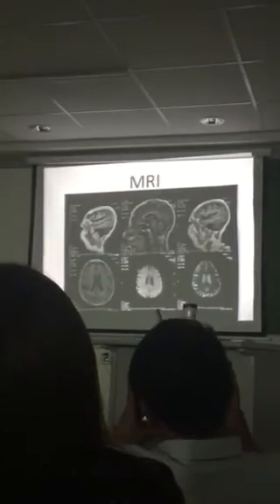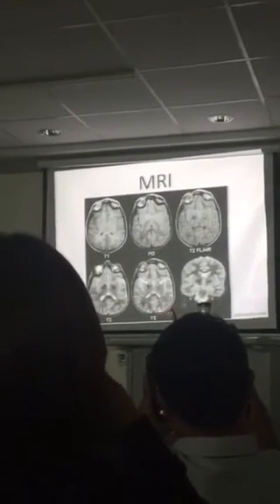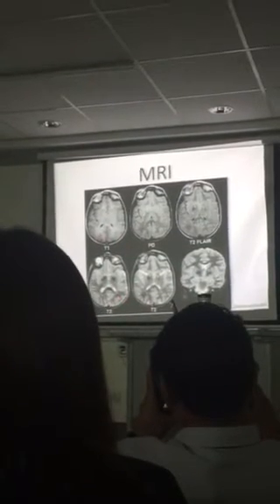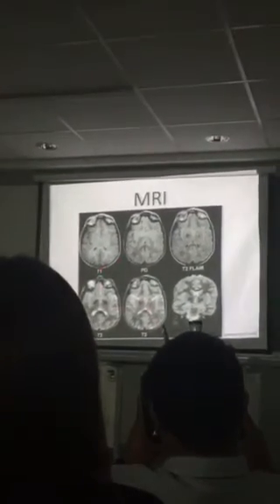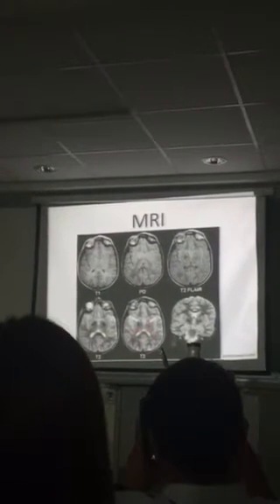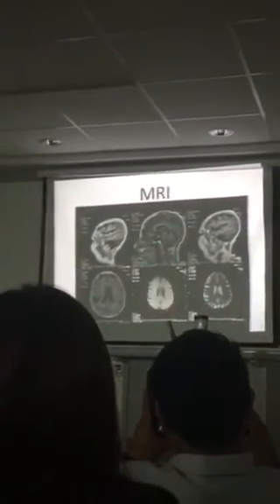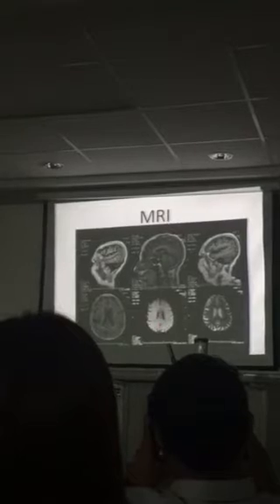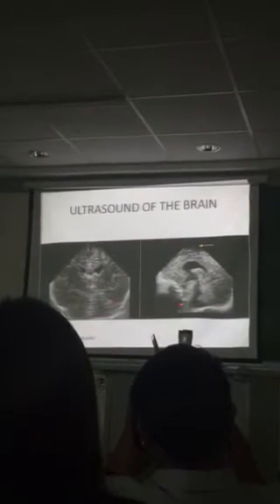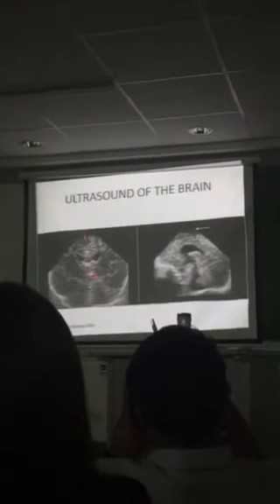Okay. So which one is T1? Do you know how to differentiate whether it's T1 or T2? Water is white in T2. This is FLAIR. If asked what diagnostic modality? Ultrasound. Ultrasound. It looks like a brain.